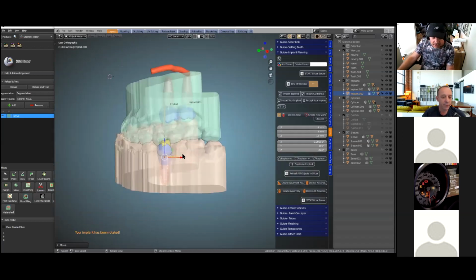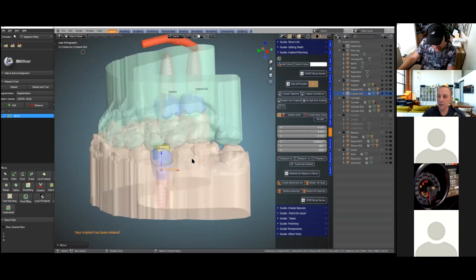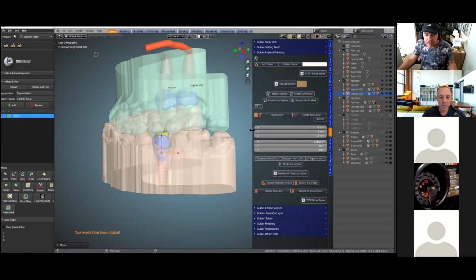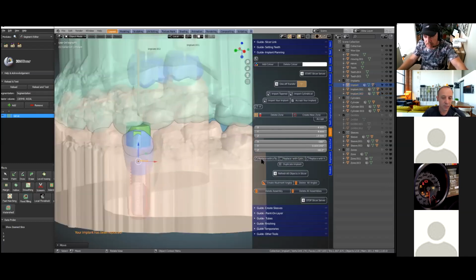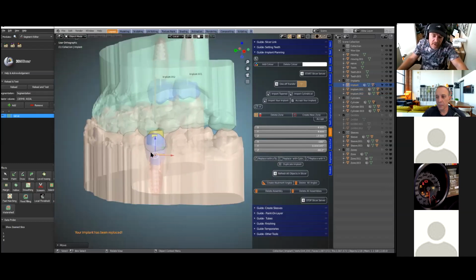You just do a rough placement first using the teeth and the model and things like that. And then at this stage, you'd probably look at it in the DICOM viewer first, and then if you wanted to change it to a cylindrical, for example, you just select cylindrical and it'll change, or conical. If you want to import your own implants, you can. I don't have my component module here, but we've explained how to do this in a video.